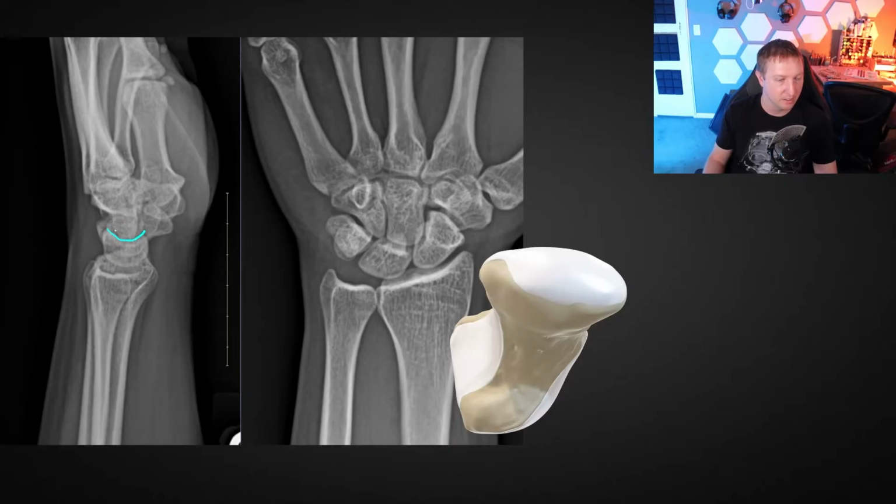So if you look at the lunate here, the tip of the cup is facing upwards. So it will hold water, if you will. I like to think of it as like a teacup. And so the axis of the lunate is here, and then the axis of the scaphoid is like this. And so if that angle increases, then that potentially could be an indication that this is actually tipped too far down. So that's our scapholunate angle, should be 30 to 60 degrees.